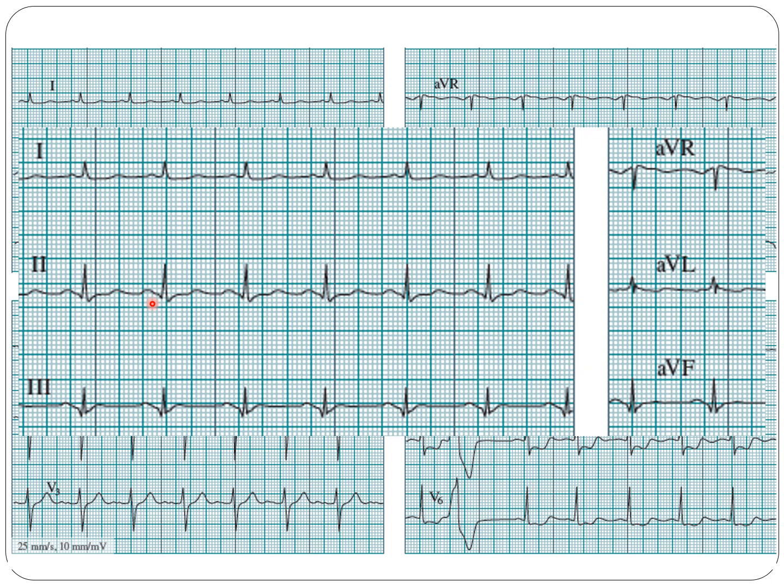Next, we have to look at the P wave. Do we see P wave? Yes, we do. In lead number 2 and in AVR. In lead number 2 is positive, in AVR is negative. So that originated from the sinus. The shape of the P looks identical to each other, so that can confirm there's a sinus impulse formation.